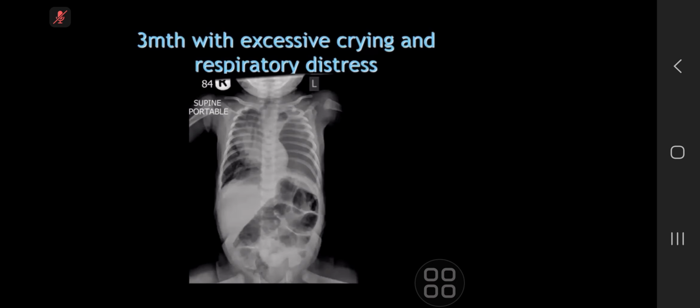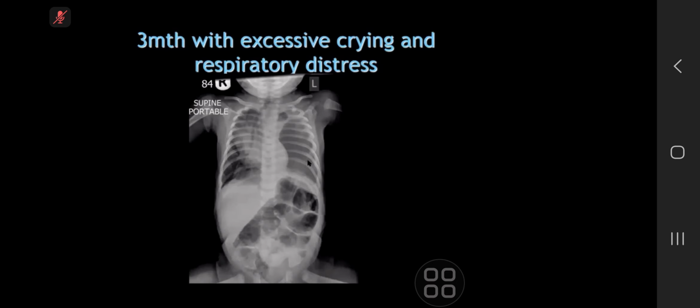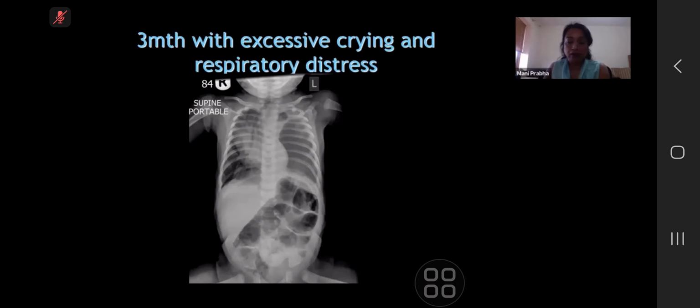Well, I mean, this could represent a tension pneumothorax, but without any history of a reason for that. What you have described is there is shift of mediastinum to the right side, and there is some haziness in the left lung, which would be caused by fluid, presumably. Sorry, say that again. Fluid. Fluid. What can cause fluid in such a way?